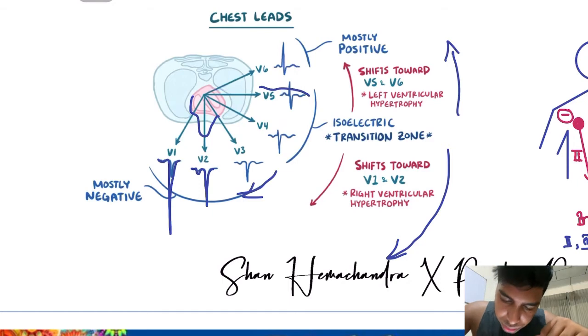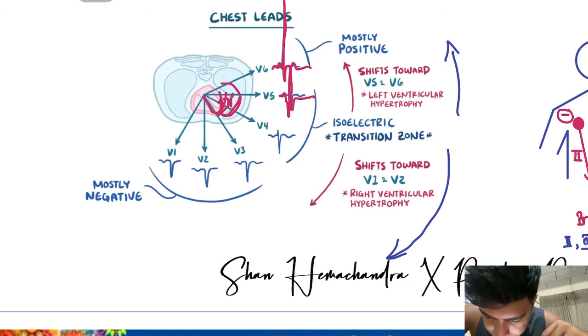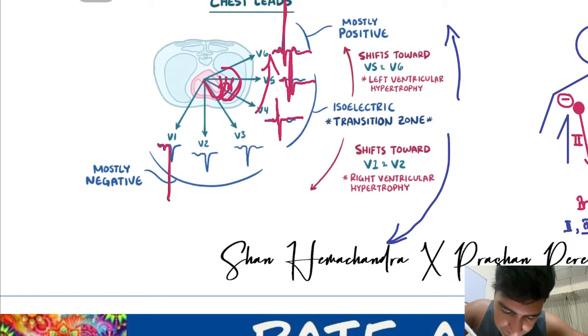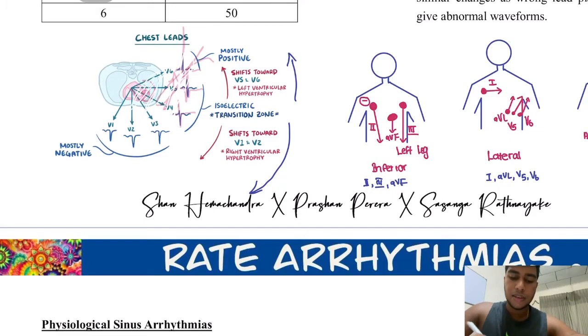In left ventricular hypertrophy, you get the opposite, because the waves are going to go more this way, there's going to be more waves traveling this way, you get a larger vector addition for V6, V5. V4 will also be a bit larger because the whole system shifts to the left side towards V5, V6. And in these you will get a dip in the S wave, an S wave dip. Remember that, try to understand that.